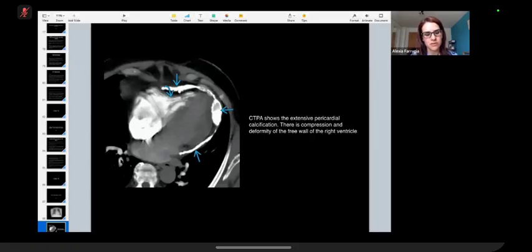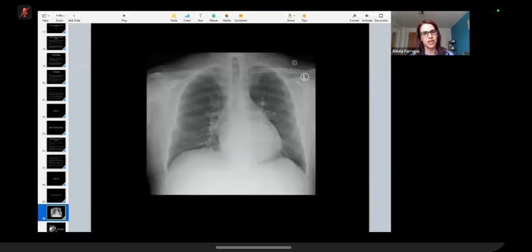Your description was appropriate. The only thing I would comment on is that when you first started presenting the chest X-ray, you said it was in a patient with dyspnea post-MI. That showed me, if I was an examiner, that you actually listened to the history.